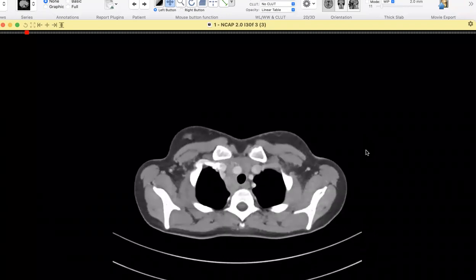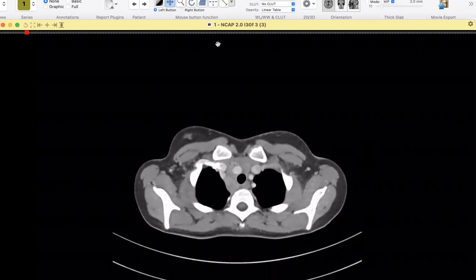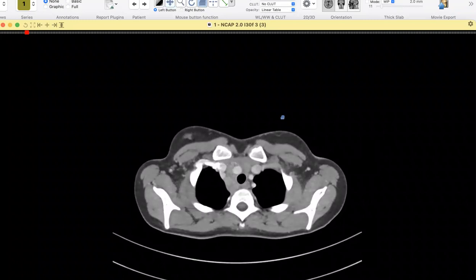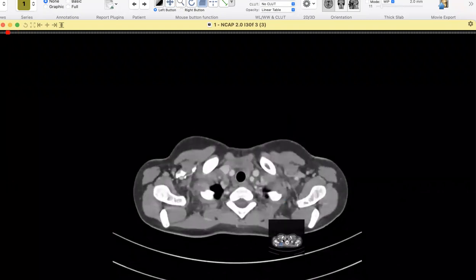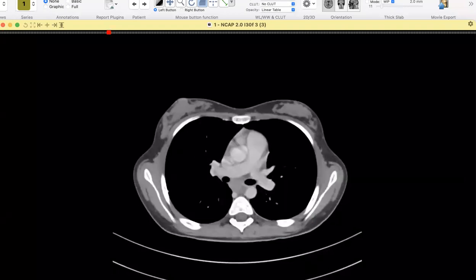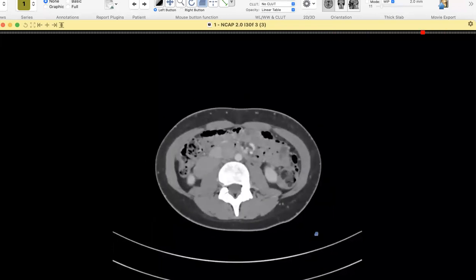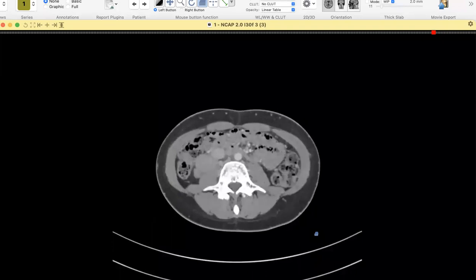Up and down, even not. Do you have a mouse wheel, or you can just select this option? Click and scroll. Now just click once. Click and scroll. Okay. You know what? Let me just scroll for you. Yes, please. Okay, good.